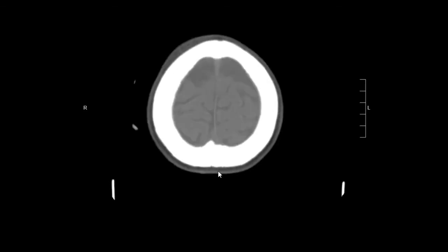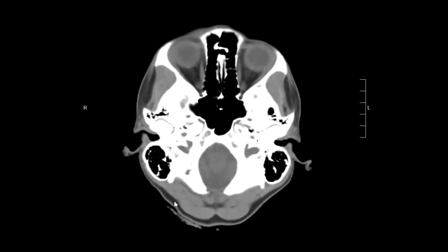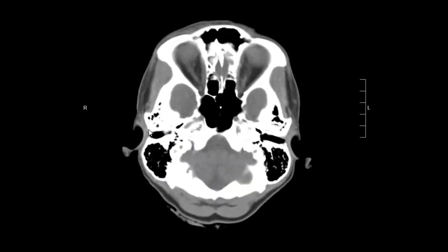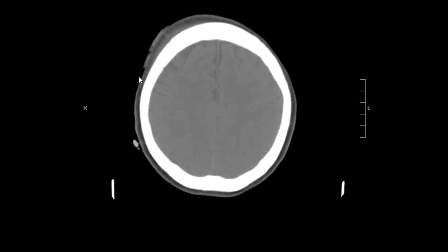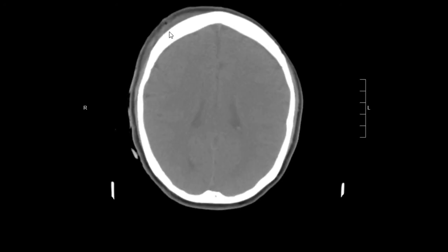We're going to switch to the soft tissue window. Oops, here we go. And evaluate the scalp. And so posteriorly, the scalp appears normal. On the right, we have a little bit of increased soft tissue or soft tissue induration. It's probably a little bit of blood, a little small scalp hematoma, and we can see just a little bit of air. Just a little bit of air here, so this is probably a small laceration with underlying frontal scalp hematoma.